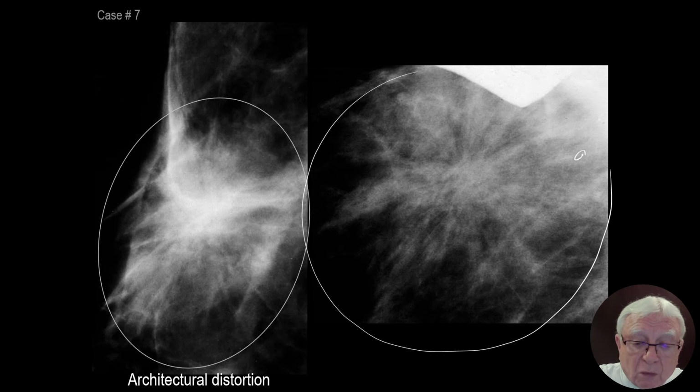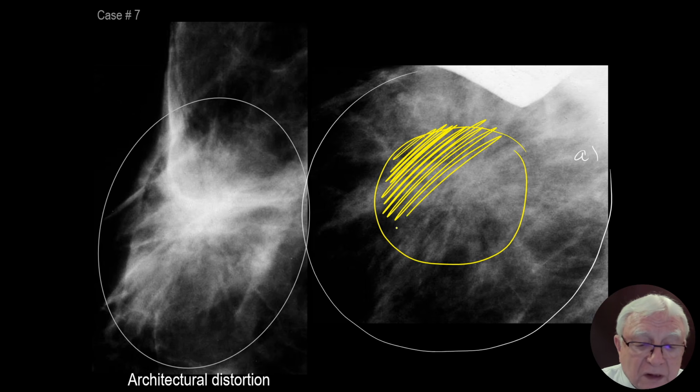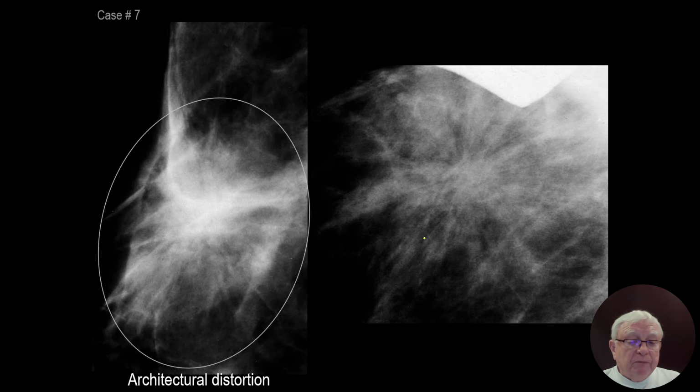Look at the radiating structure, and that's where I say, this is going to be black star. And then corresponding to this size of invasive carcinoma, we would have this kind of solid central microlobulated tumor mass. That's not. So the mammographic diagnosis is very much possibly a radial scar.